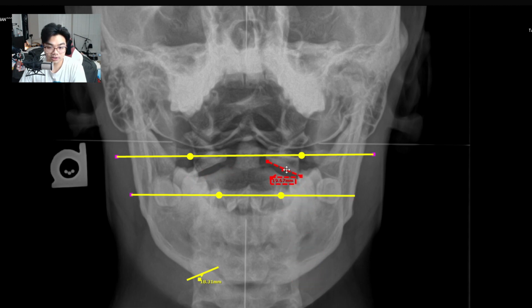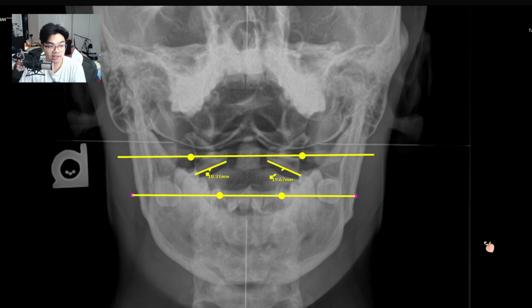This is the measurement for the right lateral mass, and this is the measurement for the left lateral mass. As you can see, these numbers are not the same, and the right side is actually bigger. How do we determine if it's anterior or posterior? It's determined by the size. Because the number is bigger, it's gone anterior. If the number was smaller, it would go posterior.